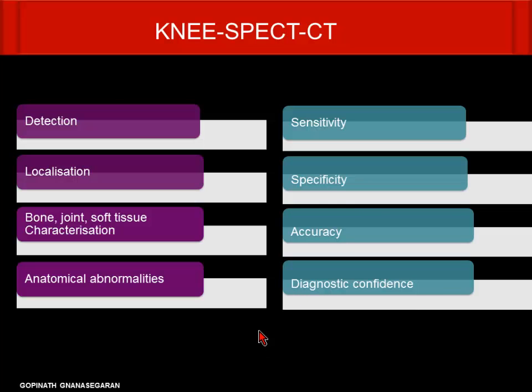Pre-surgical knee SPECT CT is overall okay, but for the post-operative knee SPECT CT, it's still evolving. If you want to do it right, you have to spend quite a lot of time with your orthopedic surgeon to find out exactly how they do the surgery, because it's not basically because of loosening. Even if there is a slight tilt, or based on the type of prosthesis they put, the patient walks in various styles. So if he knows that this is a particular prosthesis, the orthopedician knows that the particular patient will put stress on the lateral aspect or a medial aspect.